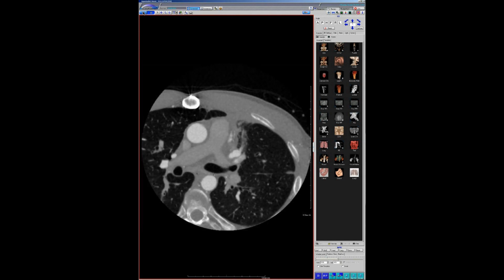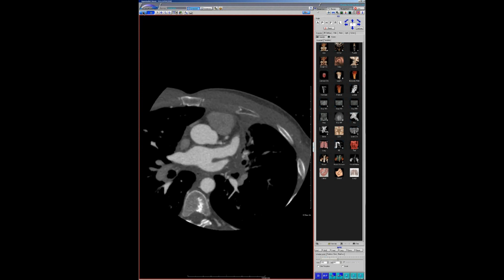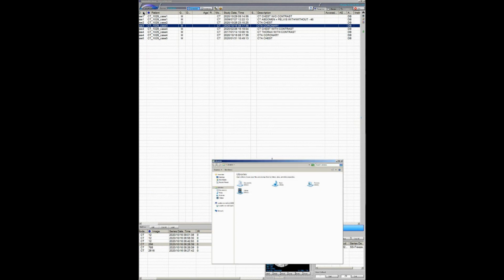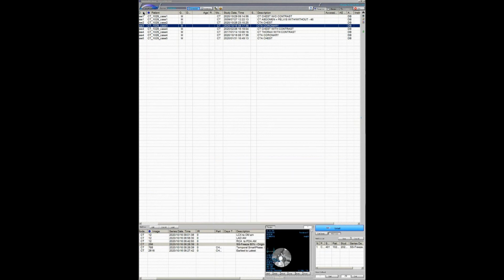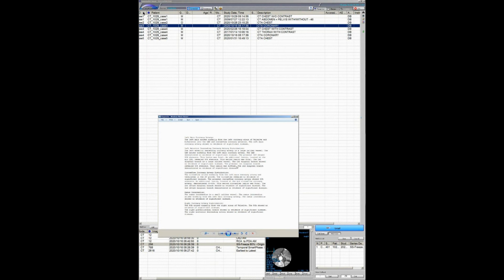And you can see here that this is, in fact, going to be a minimal aortic injury where there is an intimal defect, but there are other defects as well. And then you get this layering or these areas of thrombus associated with the minimal aortic injury. And I called up the team. I said, it's not going to make a difference. You're probably not going to do anything different, but this isn't really a dissection. In the traditional sense, this is not someone having hypertension and a disruption of the intima. This is a severe shear injury that led to a lot more than that. Anyways.